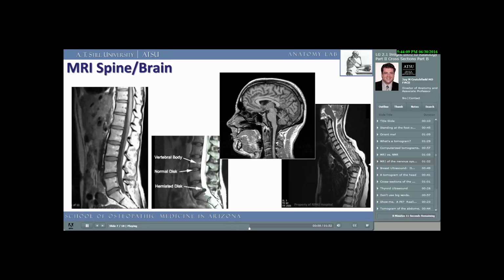Here we see the vertebral body, the normal disc spaces, and a herniated intervertebral disc pushing into the lower spinal column. This is technology given to us through Nikola Tesla's work in electricity, magnetism, and Fourier transform analysis. This technology, which relies on water density of body tissues and changes in proton spin detection, allows us to learn anatomy using cross-sectional images and provides spectacular images.